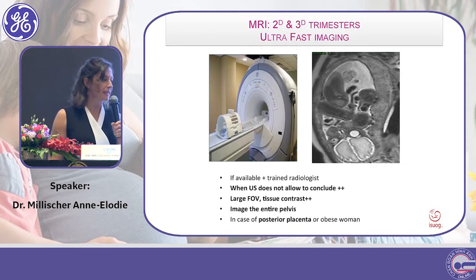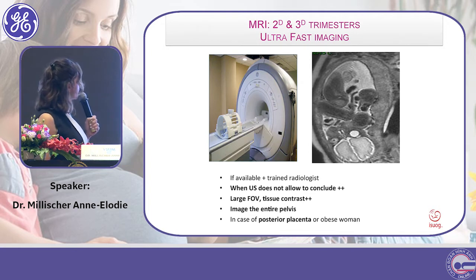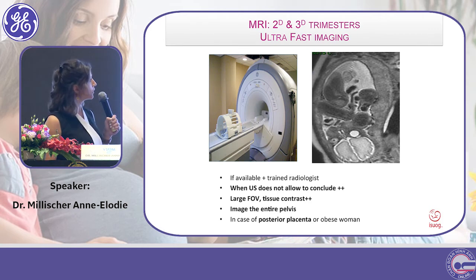Placental MRI is currently more frequently performed. The most important advantage of the MRI for placenta is that it provides a very large field of view. So it will be useful, namely for the posterior placenta, as you can see here.